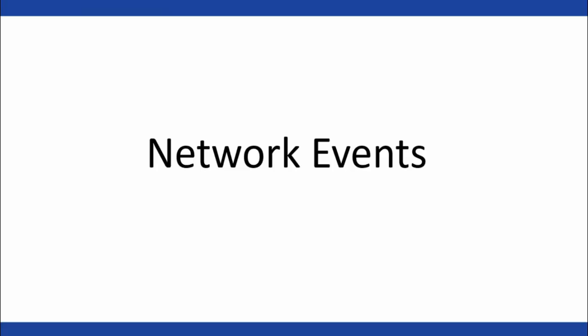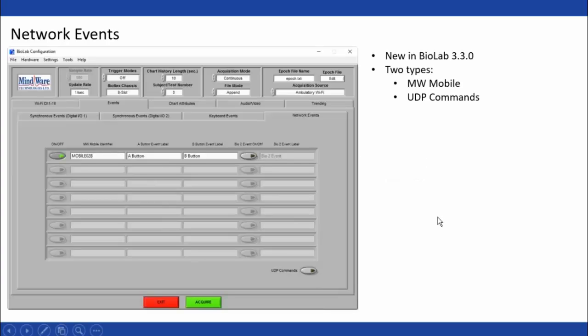Okay, moving on, we're going to talk about network events. This is something that's new in BioLab 3.3. And there are two types of network events that we can capture. One is from events that come from a MindWare mobile, and the other are UDP commands.